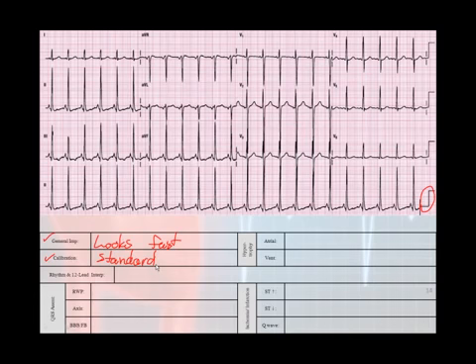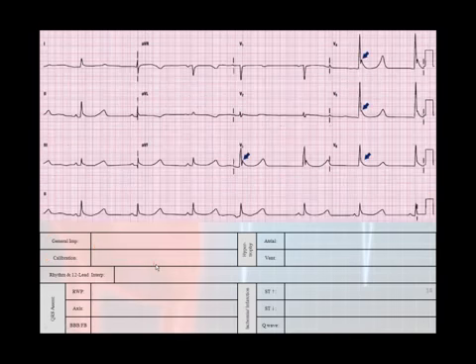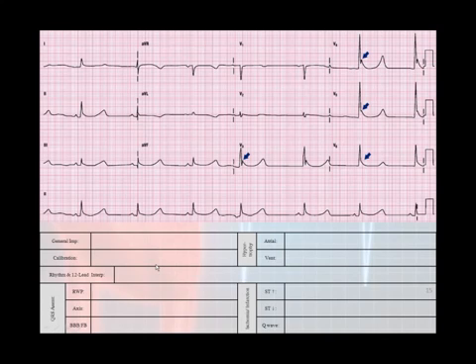Now let's try the next one. When you quickly glance at the EKG, does it look excessively fast, excessively slow, or does it look like there are any ugly morphologies? Well, just like before, because we've seen these 12 leads before, this one here looks slow. Where are our calibration markers? Well, our calibration markers are way over here, and you can see that these markers are 1 big box wide, 2 big boxes tall, which tells us that this is going to be standard calibration.